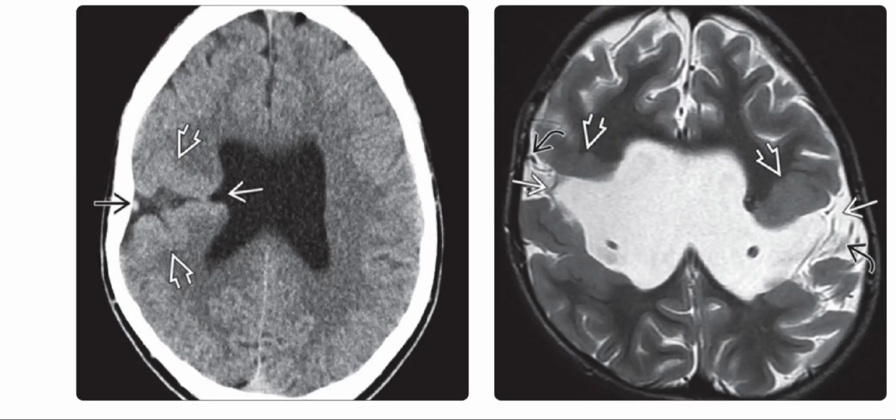So these are the axial slices. On the left side, that's a non-enhanced CT scan in an 18-year-old male with seizure history. It shows a unilateral schizencephalic cleft extending from the pial surface of the brain to the ventricle. Note the characteristic CSF nipple at the ventricular margin. The cleft is lined by thickened dysplastic gray matter.